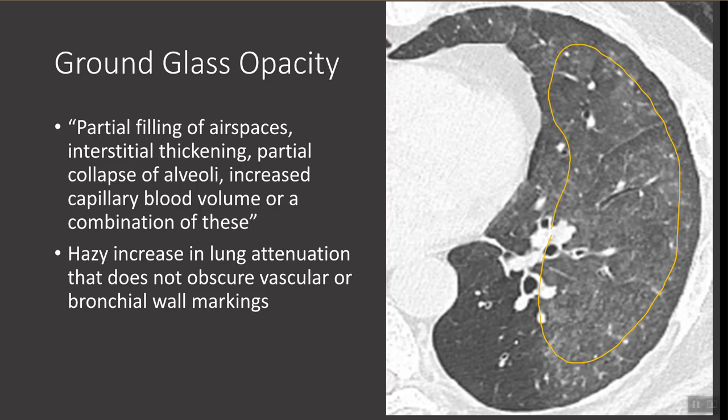Within the ground glass opacity, we can make out airways, and we could also make out vessels. So we note that the opacity is not obscuring underlying bronchovascular anatomy. In addition, compared to consolidation, ground glass opacity almost will never have mass effect. It's never going to push things away from it. It's incomplete filling typically. With the incomplete filling, there's not going to be any mass effect there.